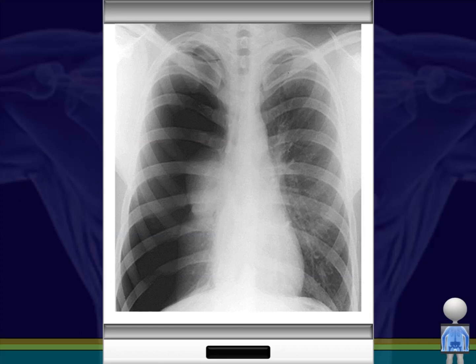So let's go through pneumothoraces. The most important thing in pneumothoraces is defining, which can be difficult, the differentiation between absence of lung tissue and air and clear lung. This is also a time when, remember we talked about exposure? An overexposed film may easily be too dark, and that means that you could miss this, correct? So make sure your exposure is good. Exposure needs to be good.